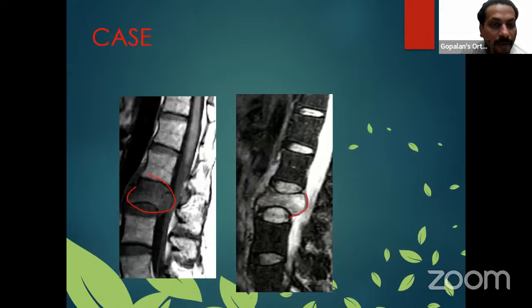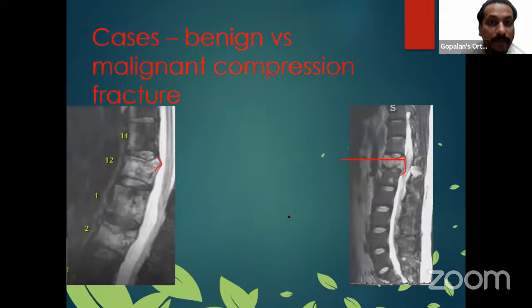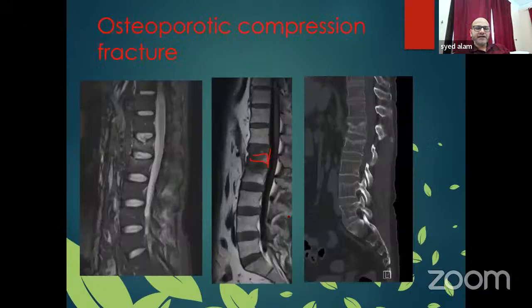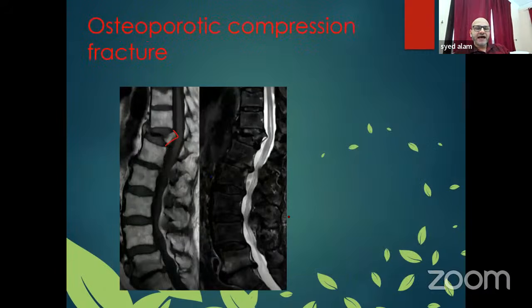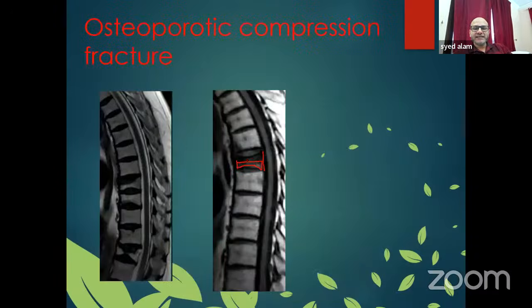So in a benign fracture, it either can be straight or it can be angulated, right? Angulated, correct. Two options for a benign. Yeah. And most of them will have a band of normal marrow signal like this. Band, total band. Got it. They will have a marrow signal.